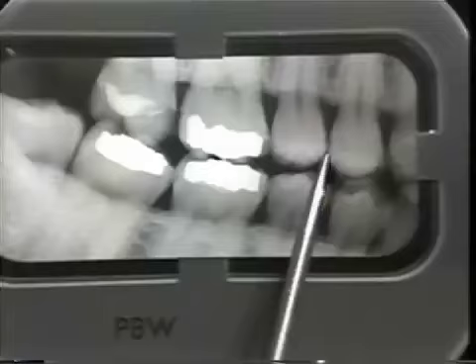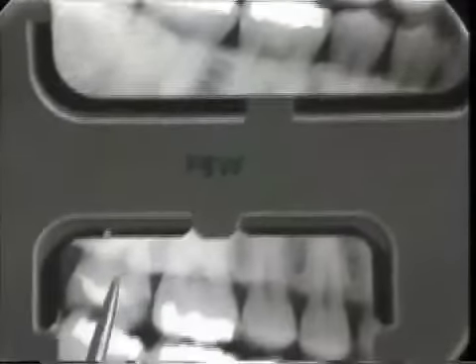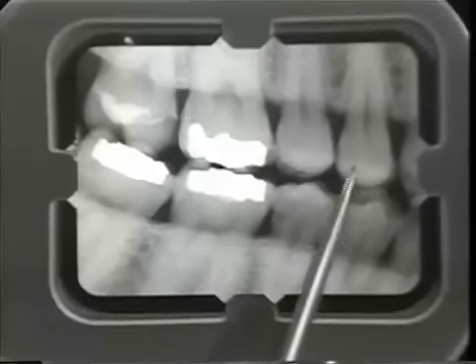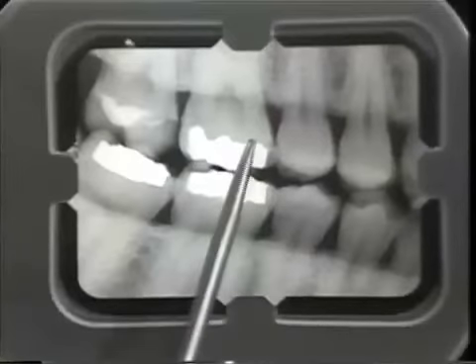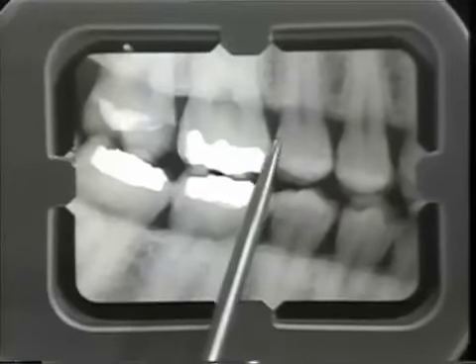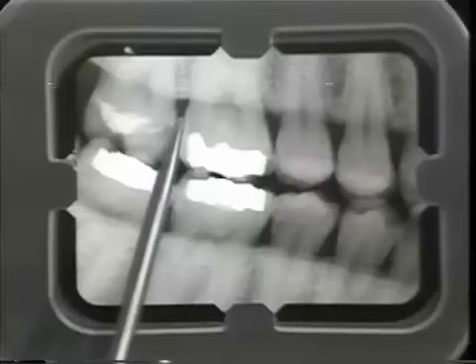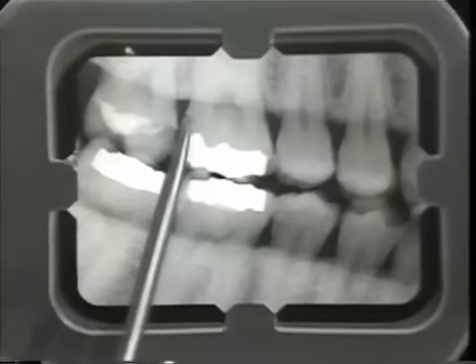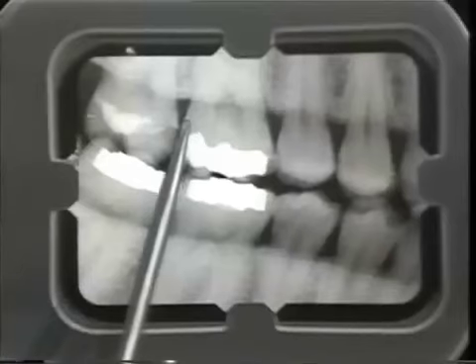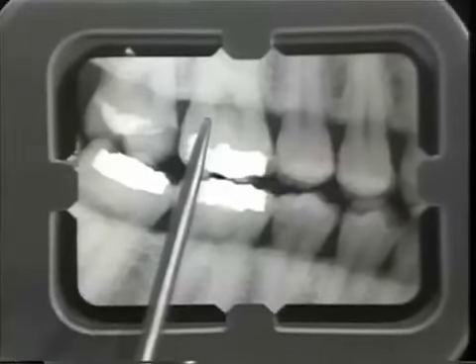We can verify the findings here by looking at the other smaller film, the number 3 size. And they do coincide. As you know, the posterior bite wings are exposed for the purpose of finding carious lesions. The periapical radiographs are made for the purpose of examining the entire root form and condition around the apex, condition of the bone around the teeth.